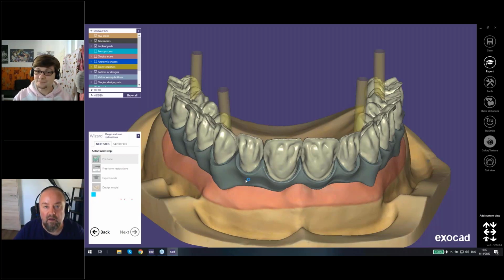Friedemann? Yeah. Could you maybe show, there was a question about the multi-level shrinking. I think we could maybe show that if we go a step back, where you did the cutbacks, where you selected the cutbacks. Yes. You could explain in that step the multi-level shrinking, or maybe you'd like to show that at the end. I don't know. I think I'm going to show it at the end because now I don't want to. Okay, great. Press back while it's calculating. Yeah, okay.